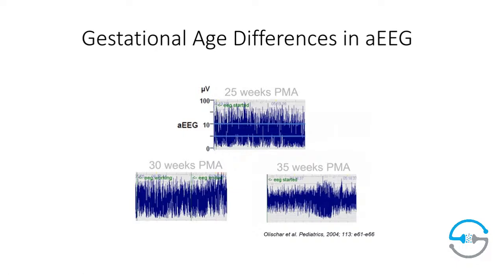And just because they're preterm, it's not just okay to be discontinuous because you're preterm. There comes a point where the pattern itself is dysmature, that we don't have enough cycling, we don't have enough continuous activity. The lower margin is not reaching up towards that 5, and that is not normal. So it is still considered ill, even though it is not a term baby brain. So just trying to make sure that you're thinking about that as we have expectations that the aEEG will improve with time.